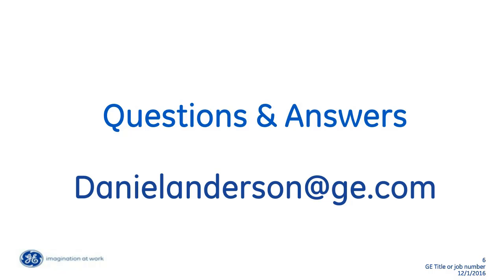So that concludes this very brief demonstration of DaTQuant in Xeleris 4. We've looked at how the application works, we've looked at normal database management, we've looked at the report tool. Now this video will be recorded, and I think you will be emailed a link to access it, and at some point in time as well the video will be available on gecares.com.